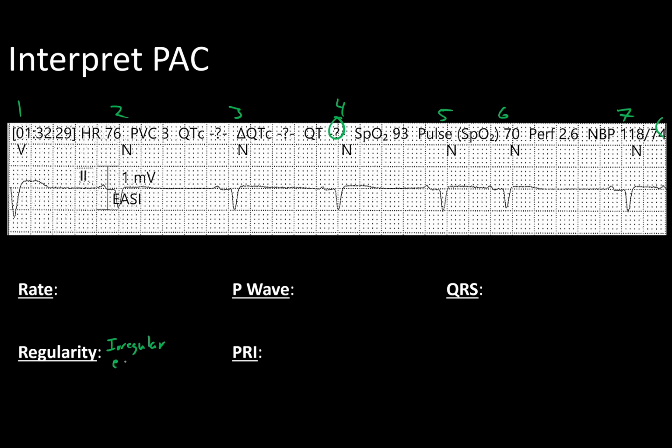And we have an ectopic early beat, but we don't see any pattern right offhand. Since it's irregular, we'll just take 7 times 10, and that gives us 70. And actually the ectopic early beat, we'll just go ahead and number it, is number 6.